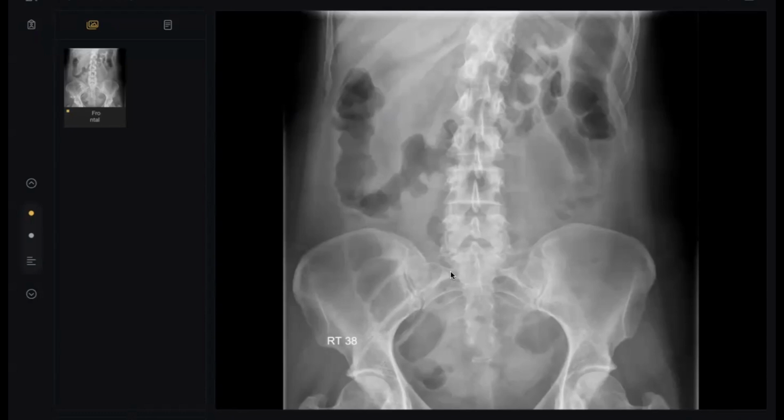I could not see the air on the left side of the colon, with some abrupt narrowing. Apart from that, there is some thickening of the haustra noted in the region of the transverse colon, giving a thumbprinting appearance. The thickening also extends into the splenic flexure and also on the right side. So in this patient with a history of fever, I'm thinking of colitis. Apart from that, I could not find any free air which could suggest a pneumoperitoneum. I can see air in the right iliac region. I can see the bowel loops on both sides.